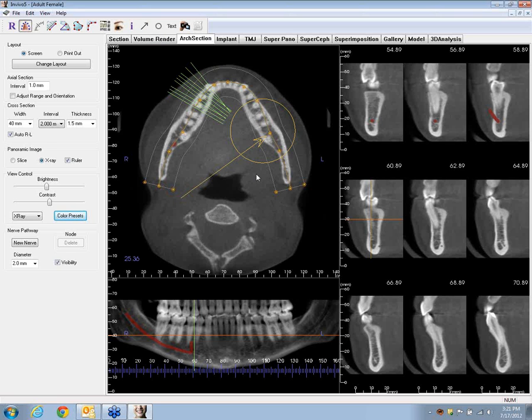Again, when we look at how Anatomage has handled the creation of measurements and illustrative points like this, it's kind of counterintuitive to folks that have been working with Microsoft or Adobe products for a while. You don't make a line by clicking, holding, and dragging. You make a line by establishing 2 points at a time. So, endpoint, click, move the mouse, click again, and it's complete. And once again, all these things, as soon as you highlight it, you can edit it by clicking, and delete.